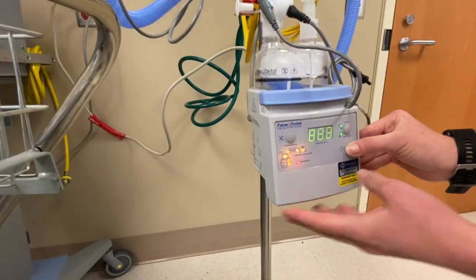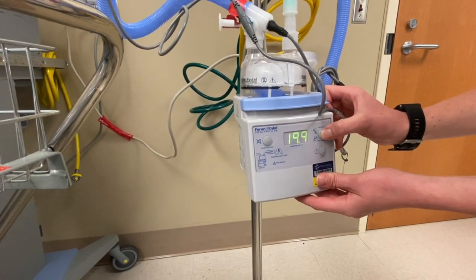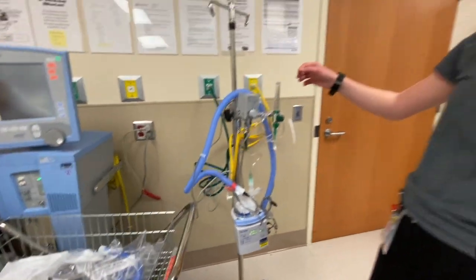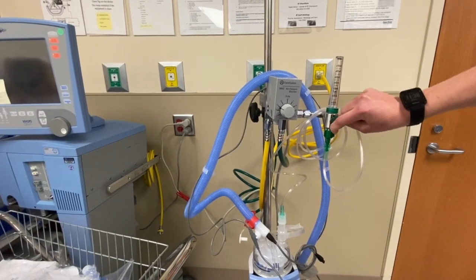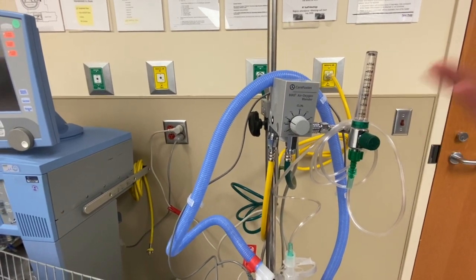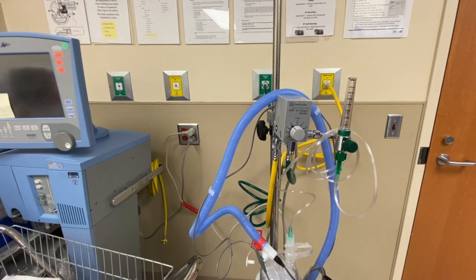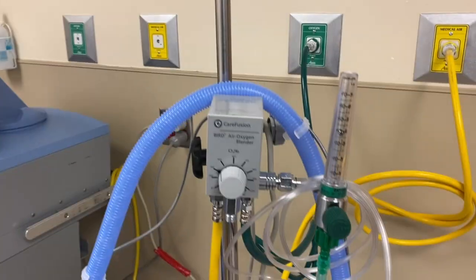We're going to turn this on just by holding it down. We're going to set it to non-invasive. We'll just pretend that we are going to be ventilating a patient on a nasal cannula. First we want to set our oxygen to 30, and then we're going to titrate our FiO2 based on the patient's oxygenation. So if their SpO2 is 80, we want to try and adjust this to get a SpO2 of 90%, so we can adjust as needed. You just want to sit and watch and monitor your patient to make sure they've stabilized around that area.